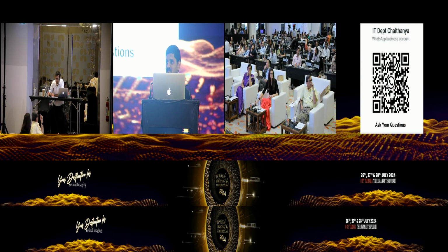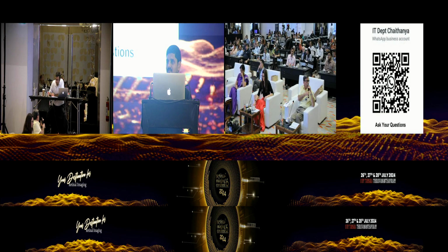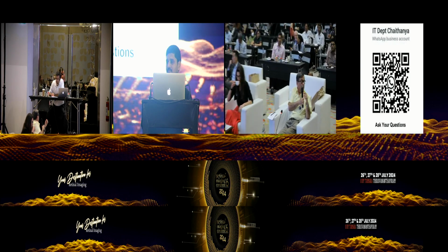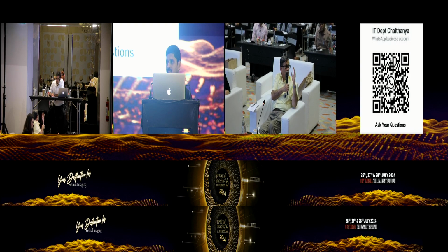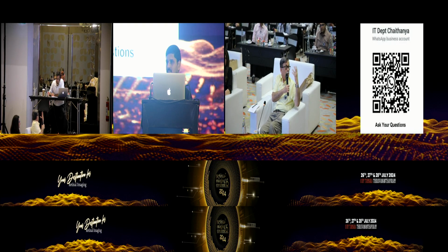I wouldn't use an FA leak as a marker for CNVM in this situation, because a little bit of RPE change could give you that false impression. Either you use an OCT angio or you use an ICG. So without either of them, how do you say it's an MNV?